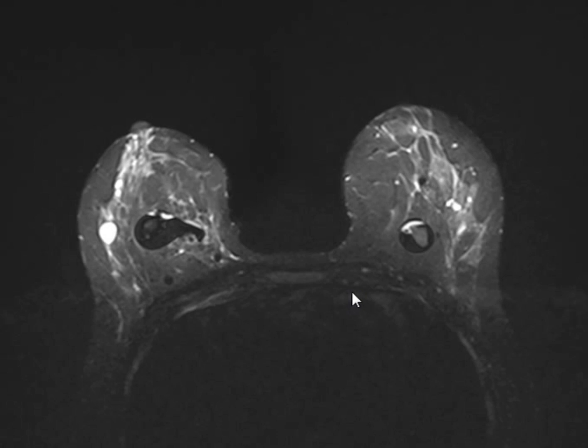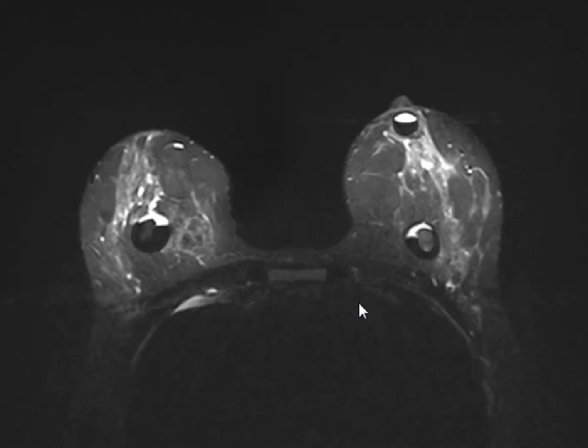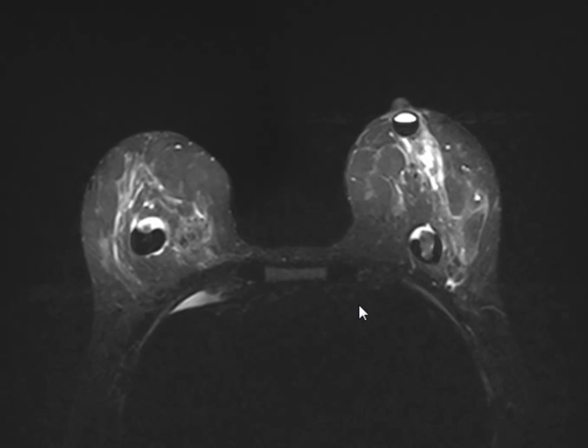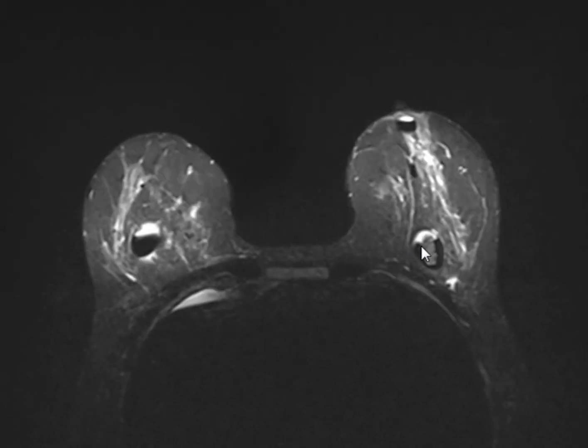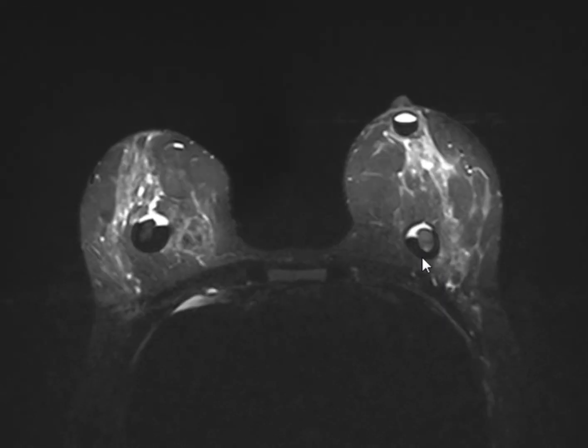Hypo, make up your mind. Central. Isointense and hyperintense. What's the hypo and hyperintense? The hyperintense is a fluid. Is it like a lesion, a tumor, a mass? Mass. Which one?